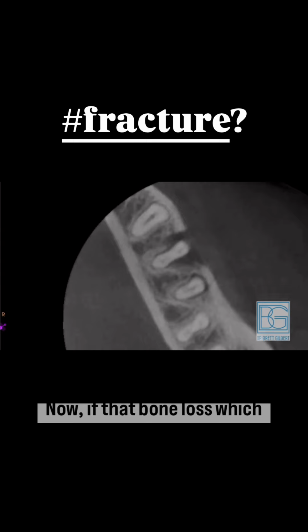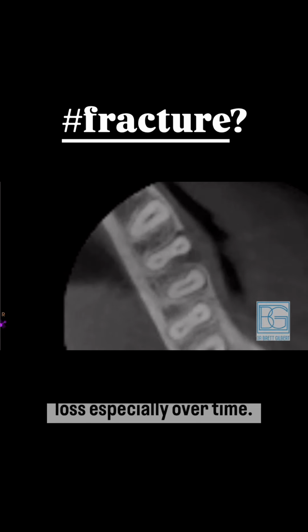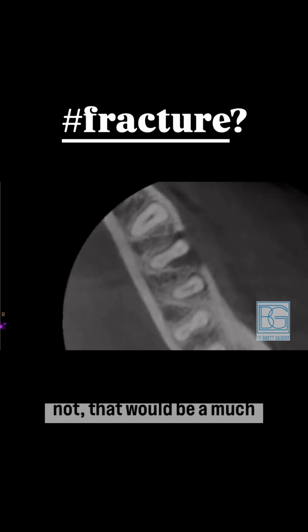Now, if that bone loss, which you see has eroded the buccal plate, extends up through the cortical plate, up through the furcation, you can see this massive bone loss, especially over time. Now, if this tooth was testing vital, which it was not, that would be a much better indicator of fracture. But this tooth was necrotic, non-vital.